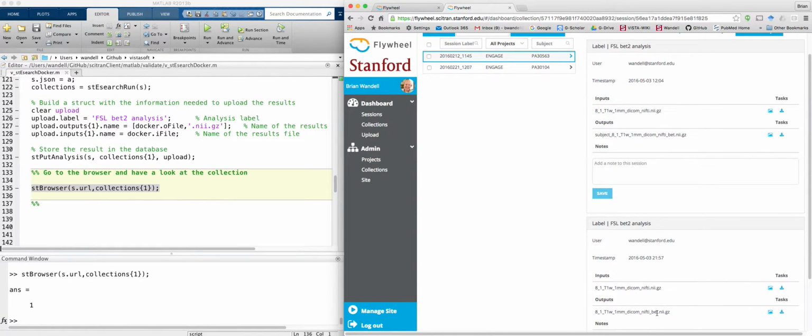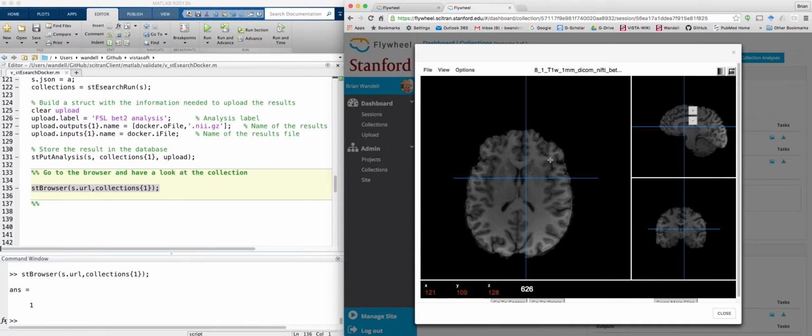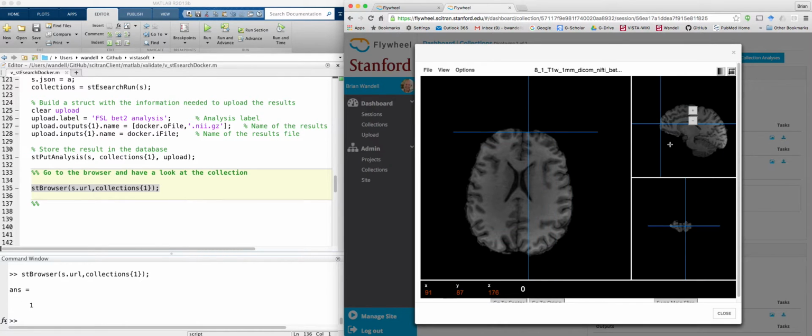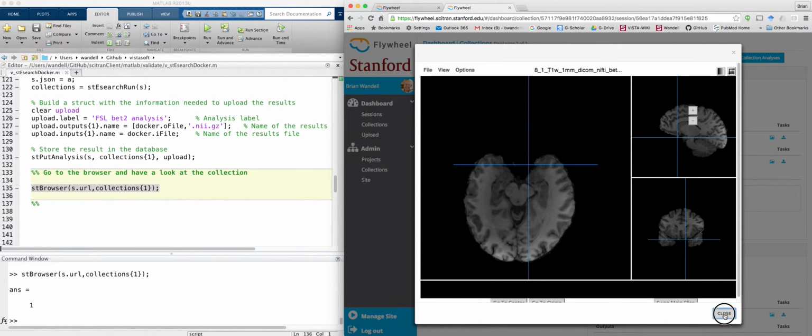And then we ran the brain extraction code, and that's been noted by the database, what was run and what the parameters were and so forth. That's stored in there. And here's the result, which we can visualize. And sure enough, the tool ran really very nicely on this data set, and you can check it for yourself. You can look it up.